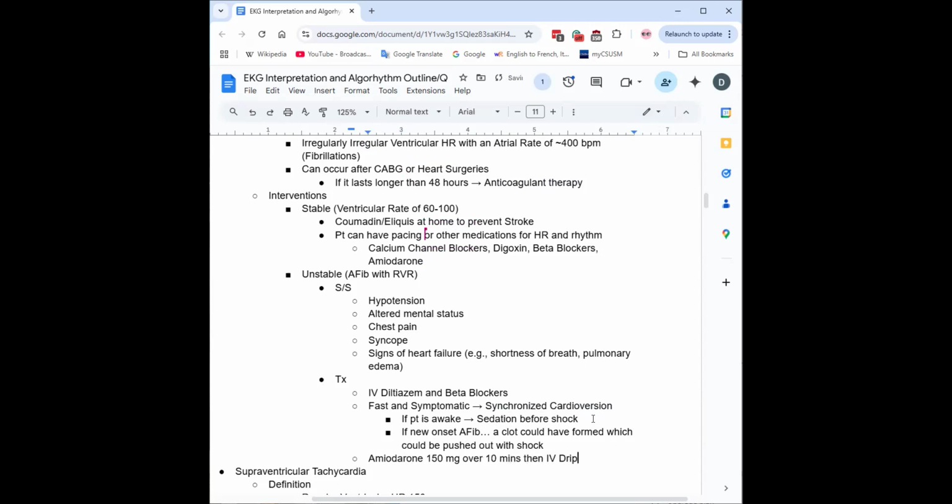It's quite a lot. I just looked up the percentage because I was curious. Studies show between 20 to 40% develop AFib after their CABG. So there's a lot of cardiac irritability going on there. This will probably be a chronic AFib for these patients. I don't think there's much hope of cardioverting those back, unfortunately.